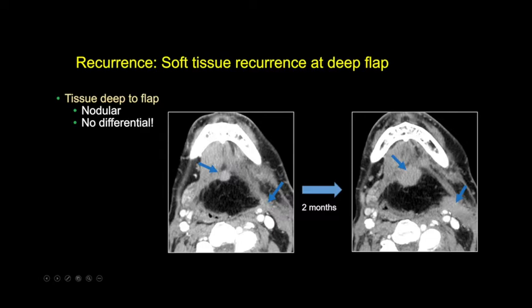There's marked widening here of the posterior digastric and anterior sternocleidomastoid muscle. It's now filling in or extending into the fatty flap. It's really very poorly defined, and this is unequivocally 2 areas of recurrent tumor. Here at the interface with the residual muscles in the floor of mouth, and posteriorly at the posterior margin of the flap. Here's the lumen or the neopharynx displaced to the right, and the lumen is almost always eccentric to one side or the other.